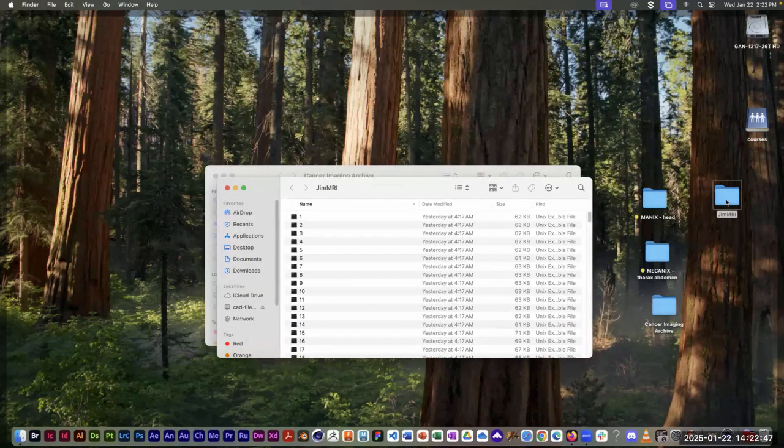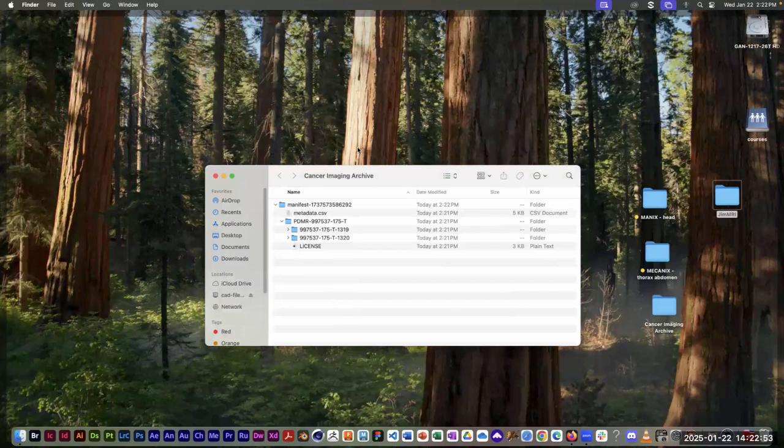this is my MRI from a couple of weeks ago. I was there on Tuesday for a follow-up with a surgeon. And while I was there, I said, hey, any chance I can get my images? And they were like, oh, sure, just go downstairs and ask them for a disc. And so they handed me a disc full of DICOM files. So I get to show you my MRI.